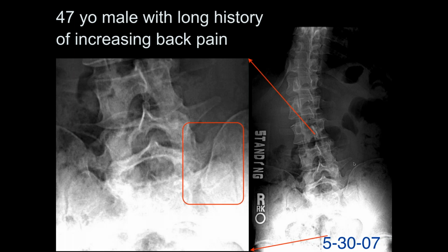Doesn't that look like there's also something? I think that's the SI joint. I mean here? Yeah, like that. I think it's hard to tell because you've got a lot of bowel stuff overlying it. The left also is hard to tell. Would you have thought that just based on this? Well, this is abnormal. Yeah, that looks abnormal. Yeah, I think that's abnormal.